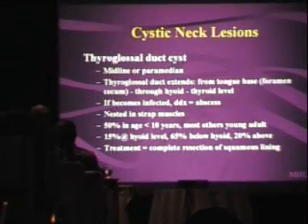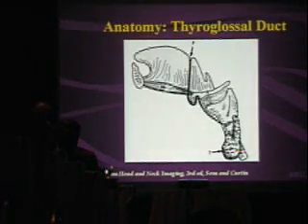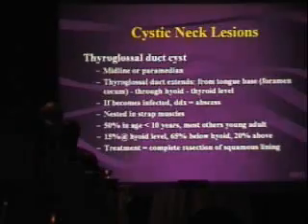So basically, it's midline or paramedian. If it becomes infected, it may not be a simple unilocular cyst. It could look like an abscess. It could be heterogeneous in appearance. It could be parasagittal, just around the thyroid cartilage, a little off midline. So don't get fooled if it's not precisely right in the midline. But certainly if it's below the level of the thyroid gland, unless of course you have mediastinal thyroid tissue, it's probably not a thyroglossal duct cyst because it has to be along that tract.